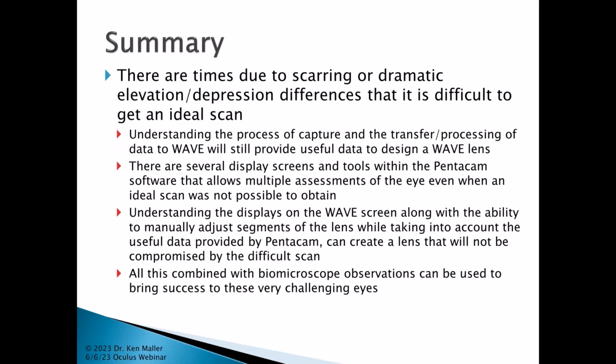There are times that are due to that scarring or very dramatic elevation depression differences that it's difficult to get that ideal scan. But if you understand the process of the capture and that transfer and processing of that data to wave, it still does provide useful data so that you can go ahead and design up a wave lens. There are several display screens and tools within the Pentacam software that allows you very different assessments from different approaches of the eye when the ideal scan isn't possible to obtain.